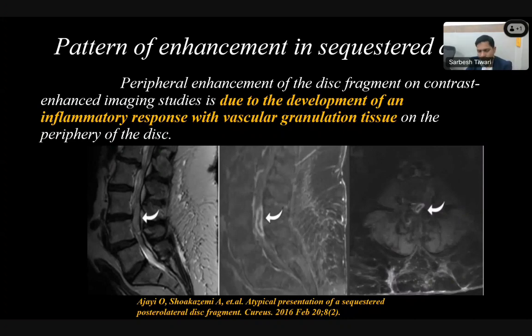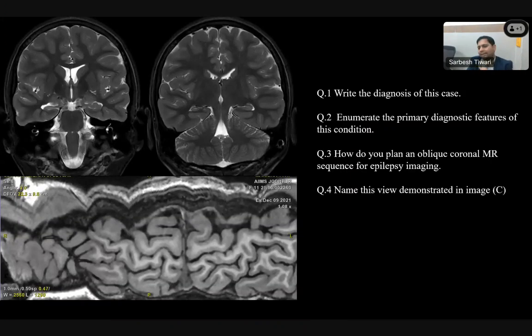So well done everyone. This was a warm-up case, an easy case rather, and let's move on to the second case. This one is also a very easy one. Tell me the diagnosis in this particular case. What is the diagnosis here?